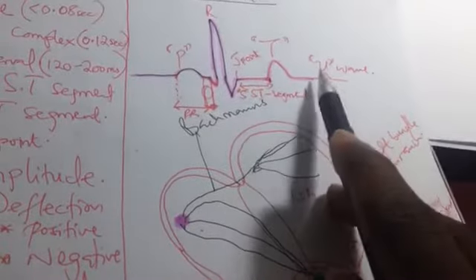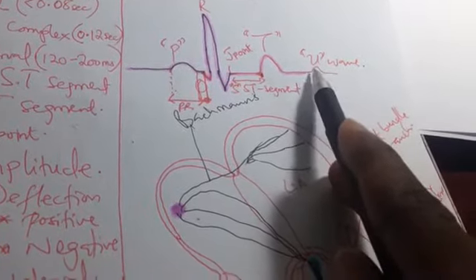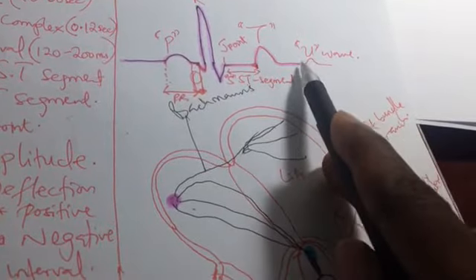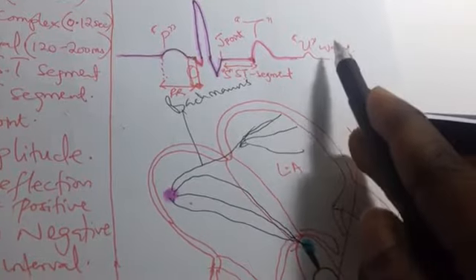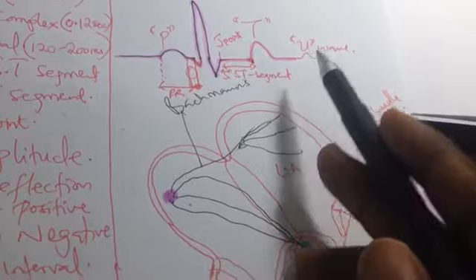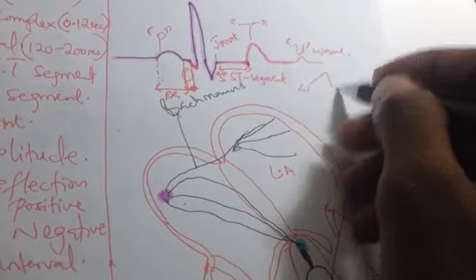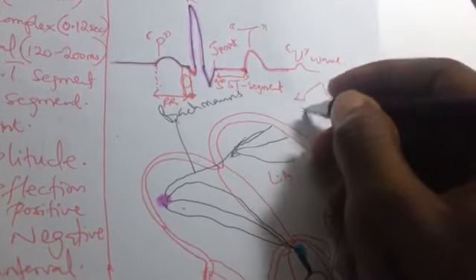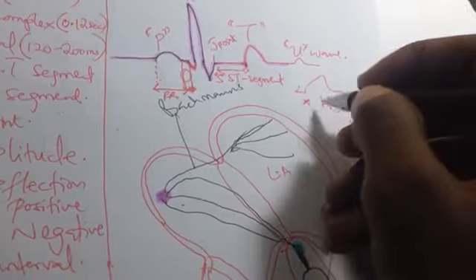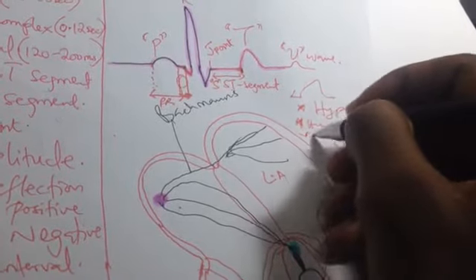So we have the U wave. This U wave is rare and normally seen only very little. You have to look very, very carefully before you see it, so it is insignificant. We don't know how and why the U wave is formed, but if it is very prominent, that is a problem, because it mostly signifies hypokalemia, that is decreased potassium in the blood, or hyperthyroidism, or hypercalcemia.